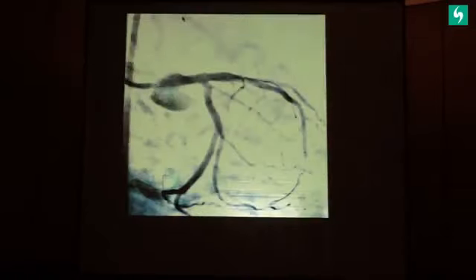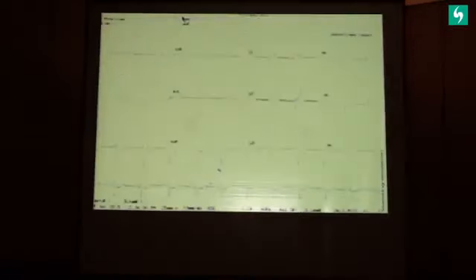This is 1 year follow-up. But just look at this ECG. This ECG does not look very serious. It looks like maybe let's work him up, let's do an echo, let's do troponin. We did nothing. We saw this AVR, mild ST depression in inferior leads, telling you the vector is heavily pointed. There's no doubt about it. And this patient is in the lab immediately.